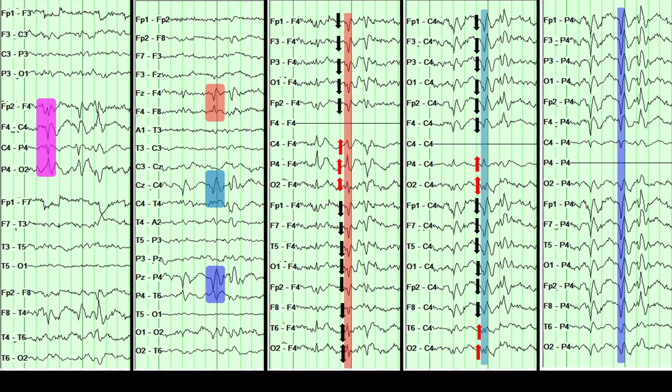In this frame, I have highlighted the potential in question again. As you can see, all potentials are in the same direction pointed by the arrow. Hence, all of them are more positive than P4. Therefore, P4 is the maximum of the negative field, that is the electrode under which the highest potential of the electrical field is found, or the minimum of the positive field.